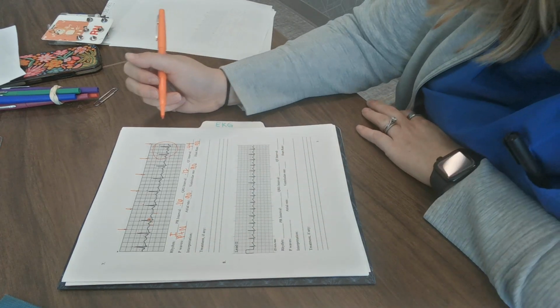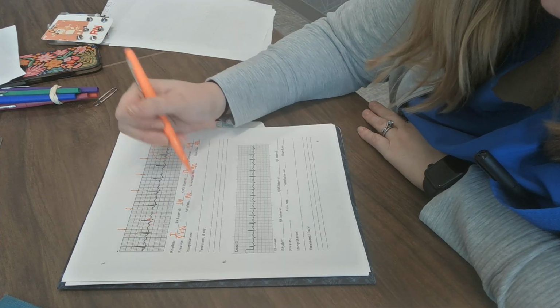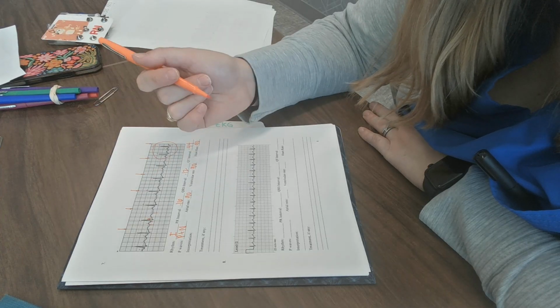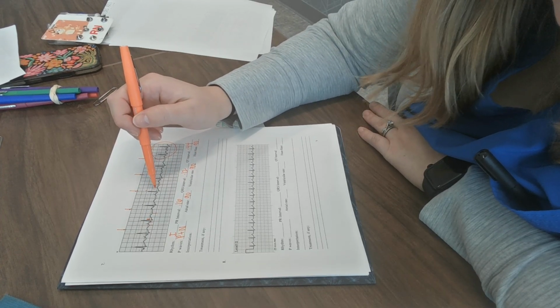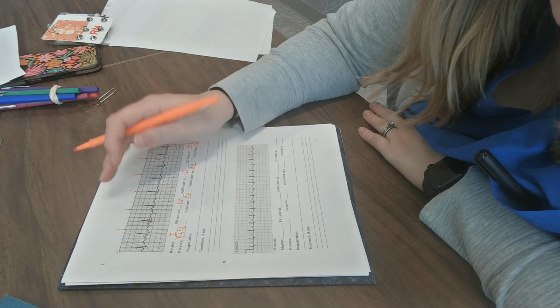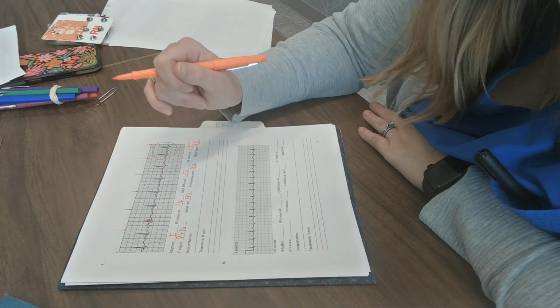Okay. Again, I do not want you stressing about exactness on these numbers because depending on which complex you pick, these numbers are going to vary slightly. Okay, so if you picked this one, you're probably going to get a little bit different numbers than if you picked this one than me picking this one. Okay, so please don't stress about that. I promise you I am not going to be that specific. I just really want you to kind of understand what's going on.